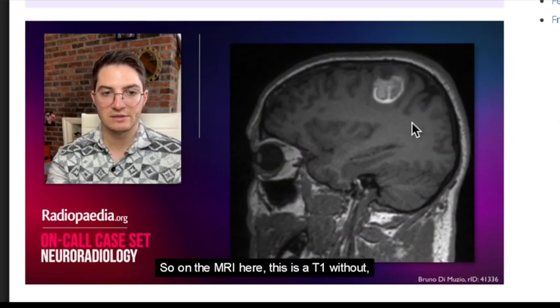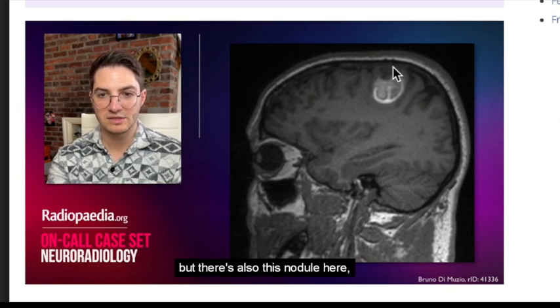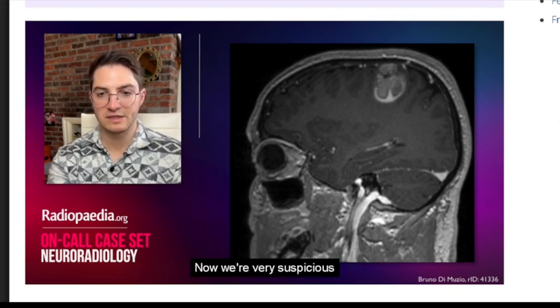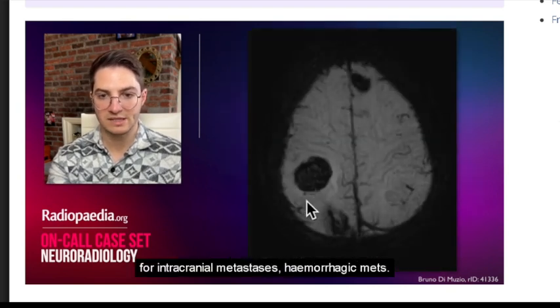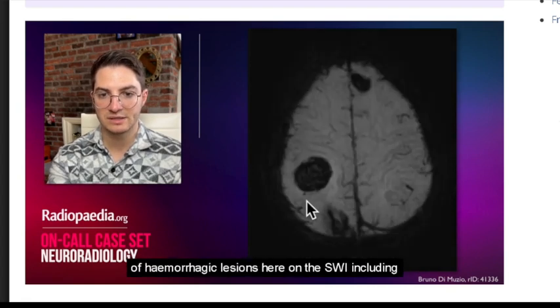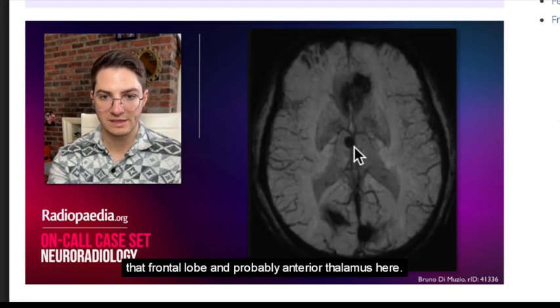So on the MRI here, this is a T1 without contrast. We see all this bright signal from the blood, but there's also this nodule here, which is relatively hypointense. And then if we look at the post-contrast, it's enhancing. So there's an enhancing nodule. Now we're very suspicious for intracranial metastases, hemorrhagic mets, and we actually see lots of hemorrhagic lesions here on the SWI, including that frontal lobe and probably the anterior thalamus here.